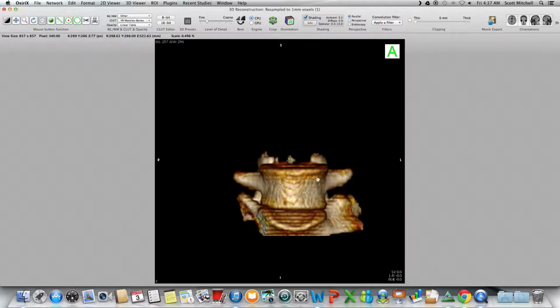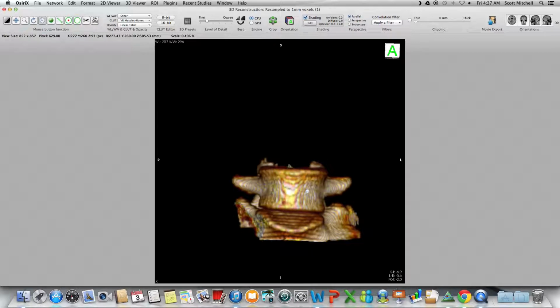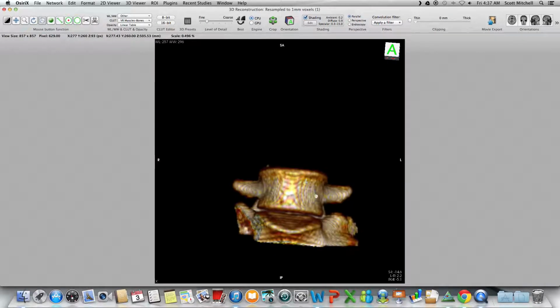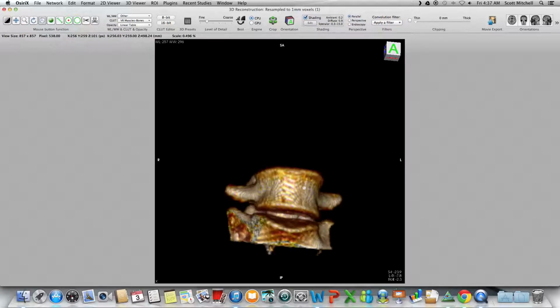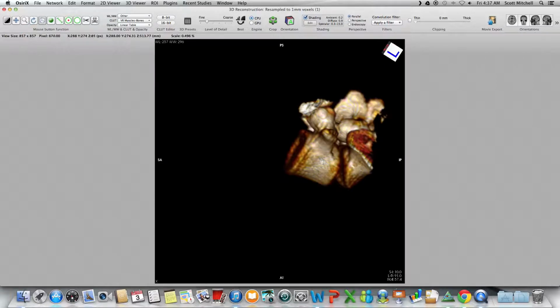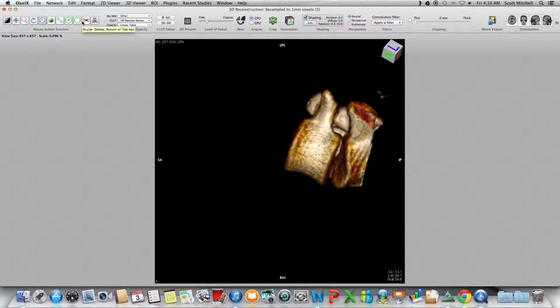Look at some of these. Okay, so here's the front-on view. Just making sure I didn't clip anything that I wasn't supposed to. I'm gonna get rid of some of this garbage over here. So I'm just gonna keep on going on this. I'm not gonna edit the video because I'm not good at editing videos, so sorry. You can fast forward or skip this part.